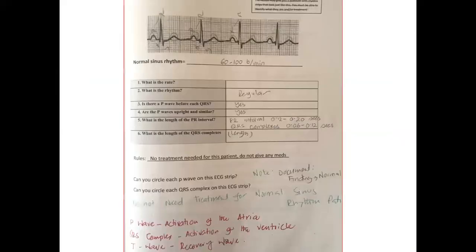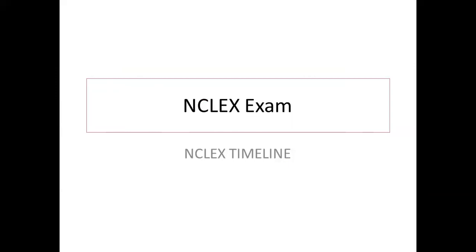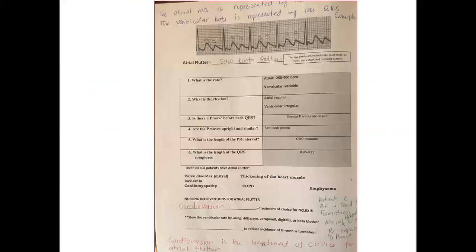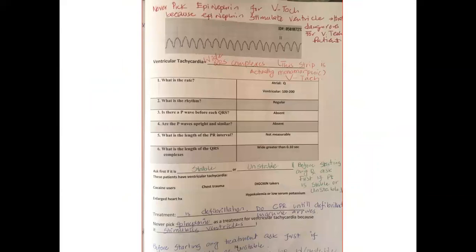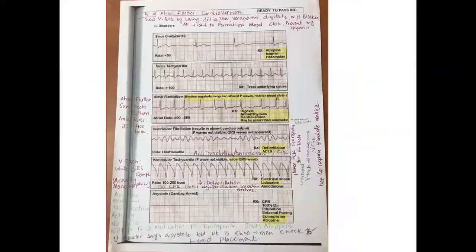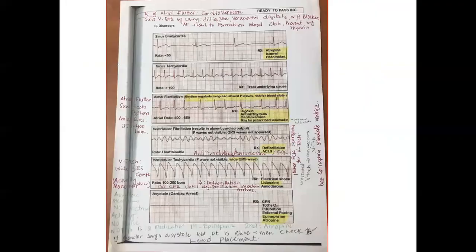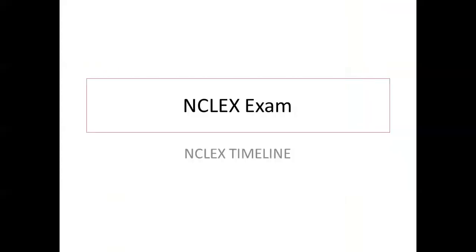Now here are a few questions about the NCLEX board exam. This is my target today. What are the different questions that come and what do we need to know for the board exam? Here I'm going to explain a few pictures that I collected for you, my friend, because this is important for the NCLEX board. If we know them, it is more than enough to answer the board question. Now let me explain one by one.